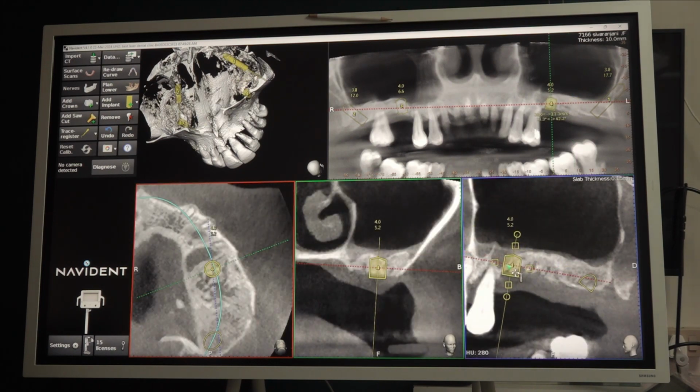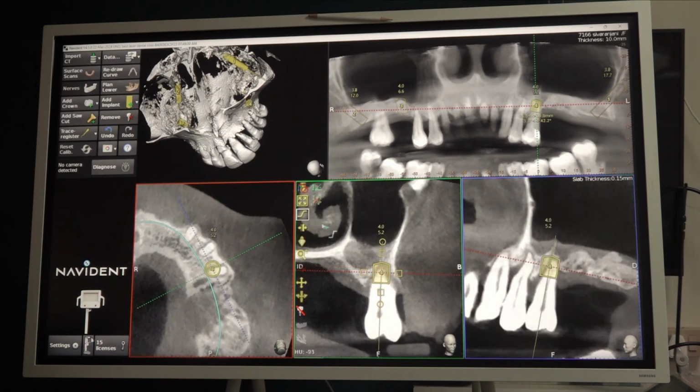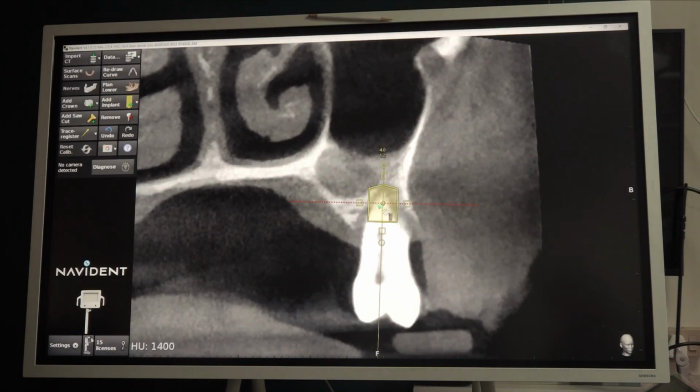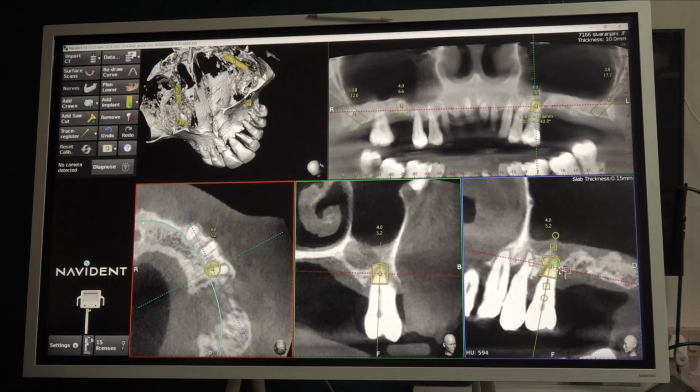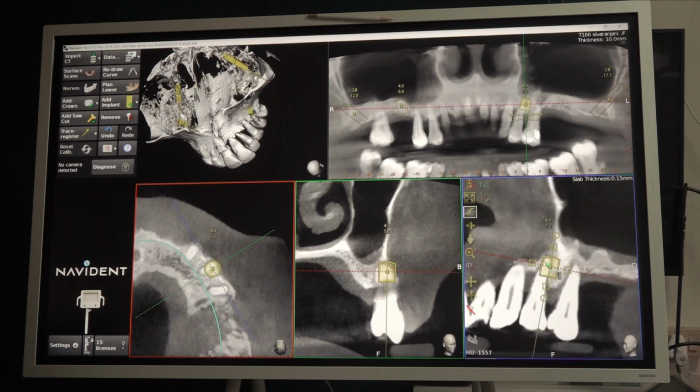So in the 5 region, so this is the 5 region. Maybe the 4 situation. This is 4, right? 4 is also not good. From 4 we will tilt it.